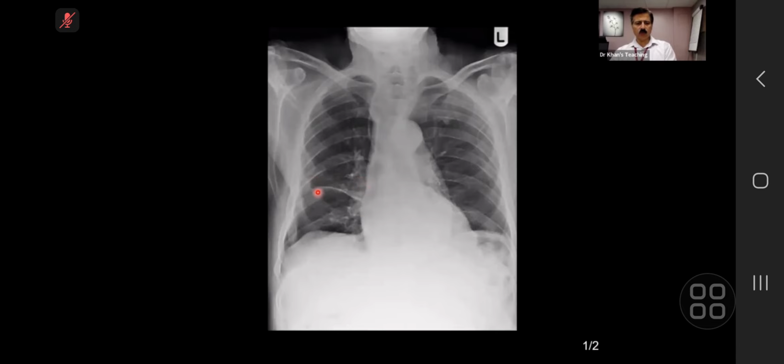Can you please tackle this? Chest X-ray. I'm not worried about the lungs here. Look at the mediastinum. What's happening in the mediastinum? Okay. So this is the frontal chest X-ray of a skeletally mature patient. What I can see is an elongated soft tissue mass starting from the right superior mediastinum along the right paracardiac border.